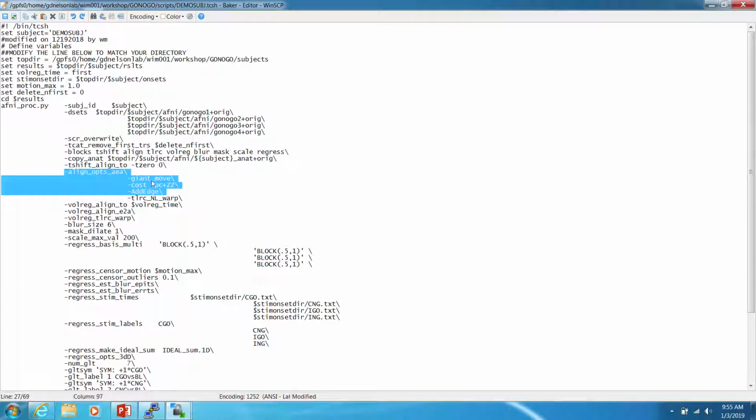And so these methods are outlined in the help file here, but it's pretty extensive and very mathematical. You can get details about those different methods. This LPC function works fairly well.